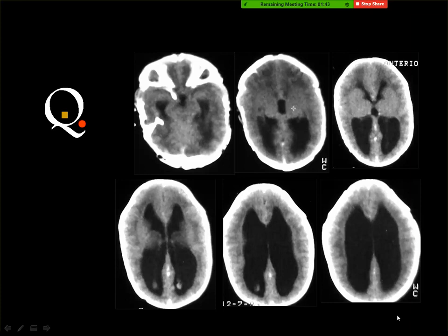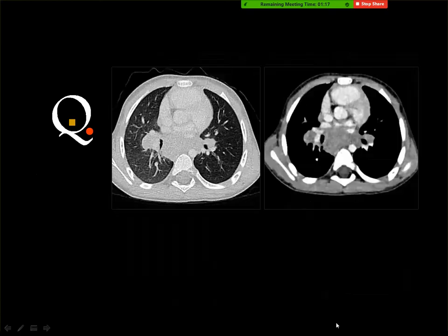Chiari two. Right. And this is Chiari two. You got a small size posterior fossa, attenuation of the fourth ventricle, a slightly dilated third ventricle, dilated lateral ventricles with colpocephaly, and the inverted V sign due to hypertrophy of the basal ganglia.